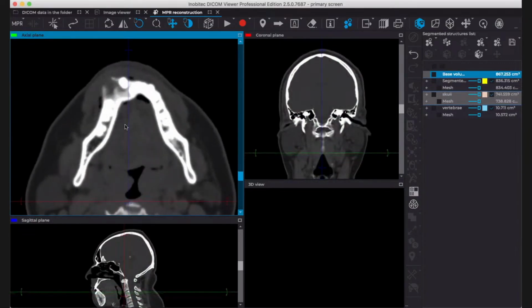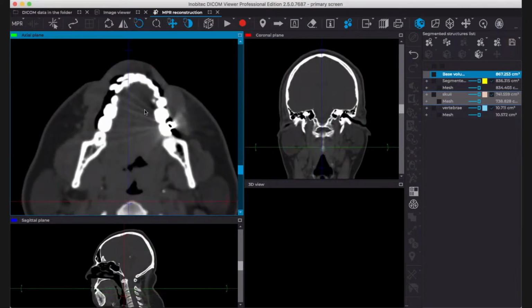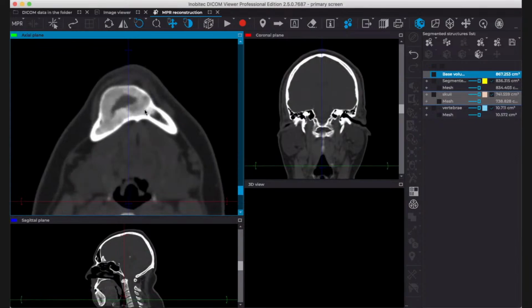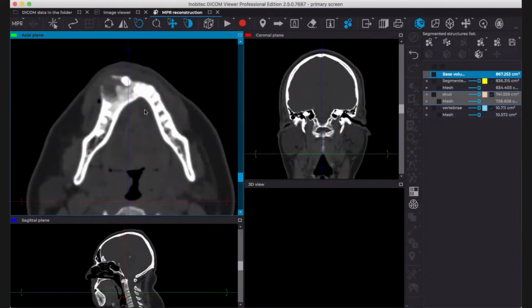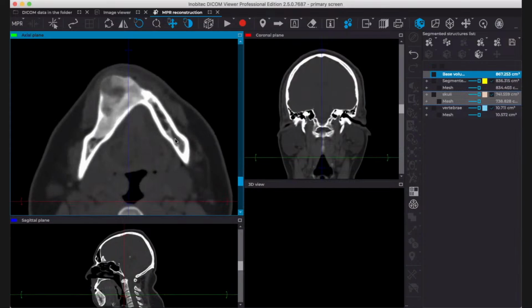So it is very, very important that this part of the segmentation is at least reviewed by a radiologist, since you will be telling the surgeon where your lesion ends, and you don't want to make that wrong, since that would lead to errors on the surgery, and could make the patients to have tumor left, even though you surgically and virtually planned everything. But you want to make sure that this step of your segmentation is really precise, okay?